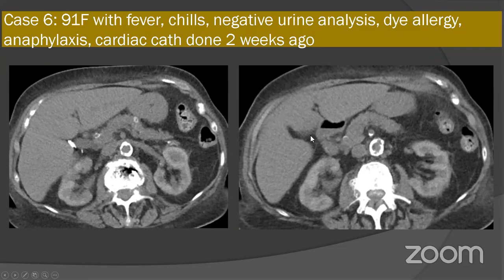First, is it a contrast-enhanced study, or did we not administer IV contrast on this examination? Yes, no. Yes, IV contrast, no IV contrast.